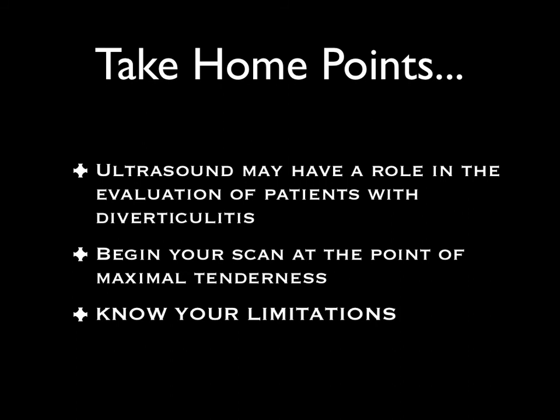Ultrasound may have a role in evaluating patients with diverticulitis, but remember this exam has not been studied in the hands of point-of-care ED providers and should not replace your CT scan. It may, however, be helpful to know the kinds of pathology you might encounter when scanning the abdomen. Ultrasound may be a useful tool in making an early bedside diagnosis or in cases where CT cannot be obtained.